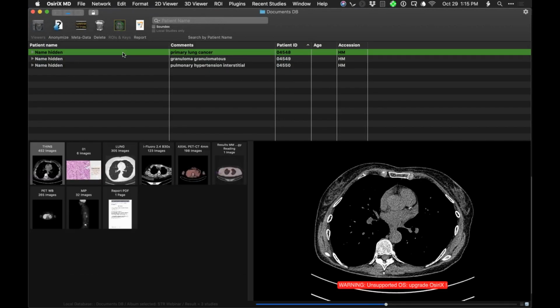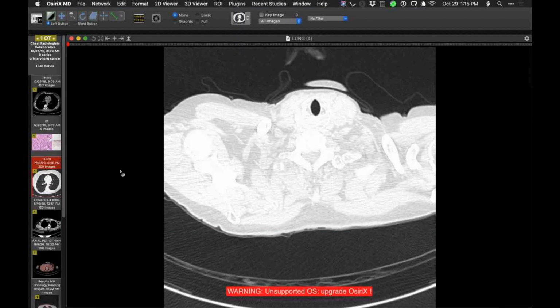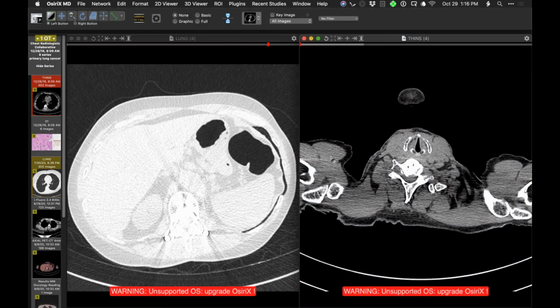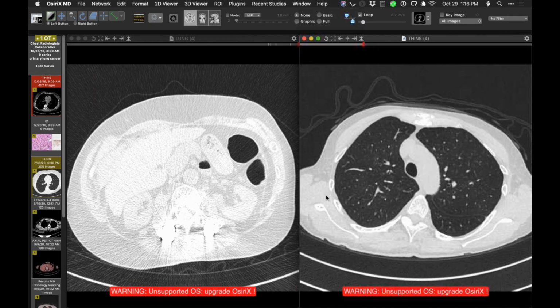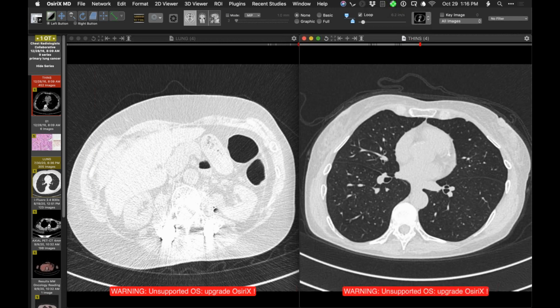So rather peculiar. Okay, here's a case. Let me show you the images that just preceded biopsy. And I'm going to put 2016 alongside. So as best I can tell, the story started in 2016 with the observation in part of ground glass, pure ground glass nodules in the lungs.